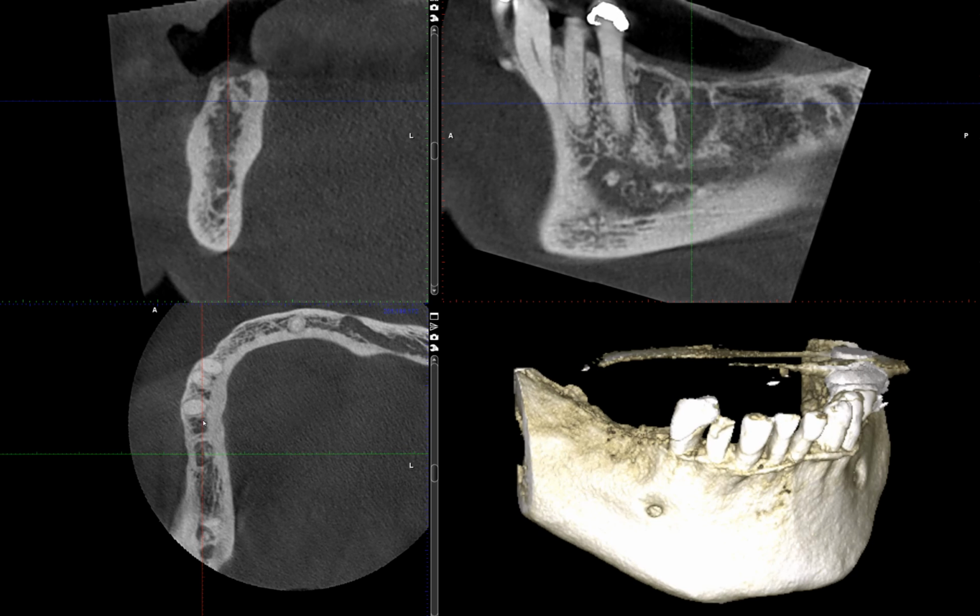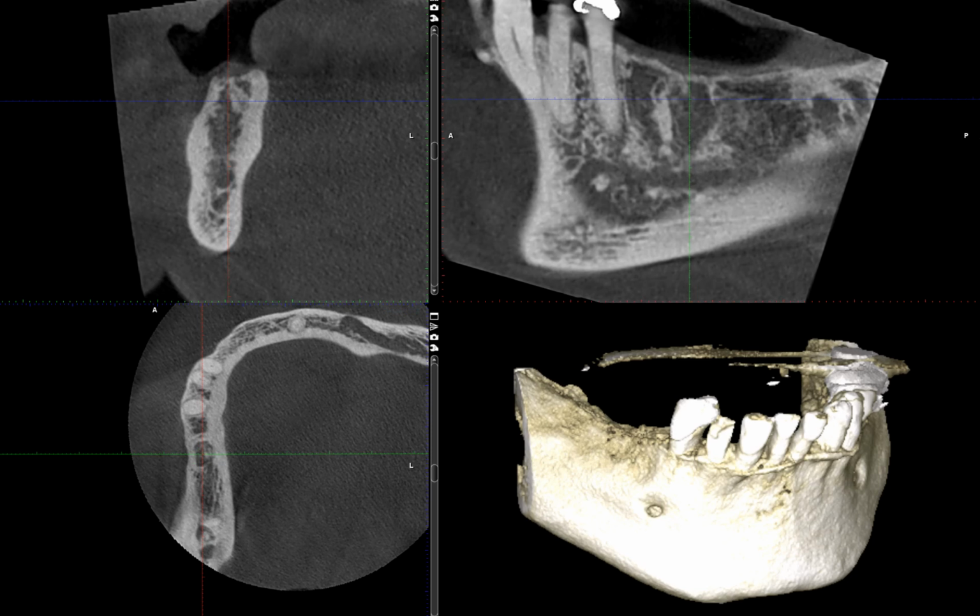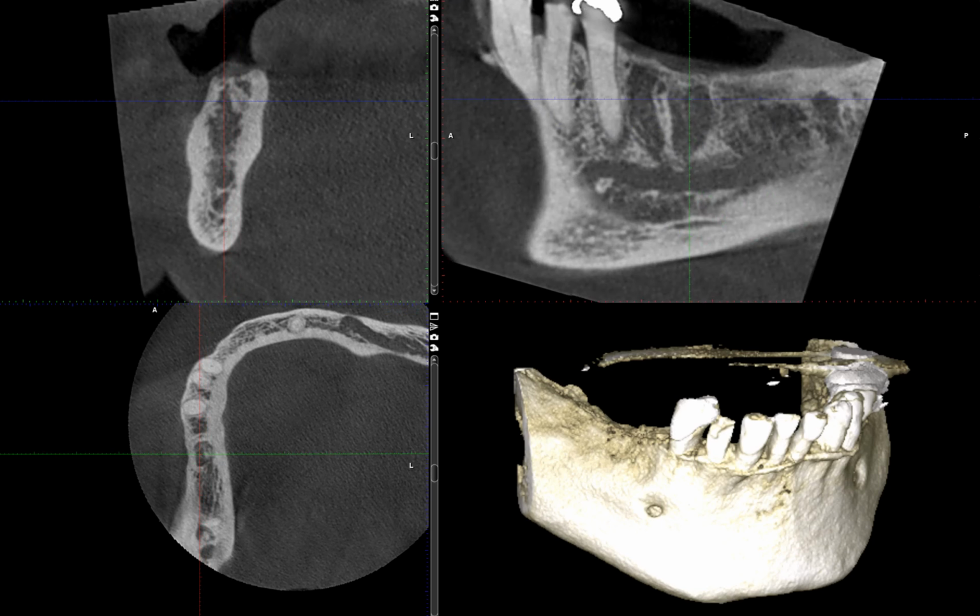Again, we can confirm from the axial view. We're seeing the cross-sectional image of the premolar, and there's the area of missing tooth number 30. So now, as I scroll through this volume, what you will realize is that you can still see the outline of the original socket, but the alveolar crest has been fully healed and established.